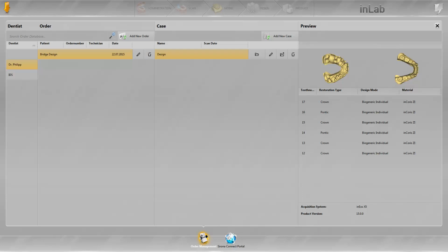The jobs could possibly encompass many cases. These can be found under Case. Cases are ordered by name and date. When opening an orange highlighted case, click on Open Case. By clicking on the pencil symbol, the name for the case can be changed. Confirm the changes by clicking Save. By clicking on the X symbol, the changes will then not be saved.